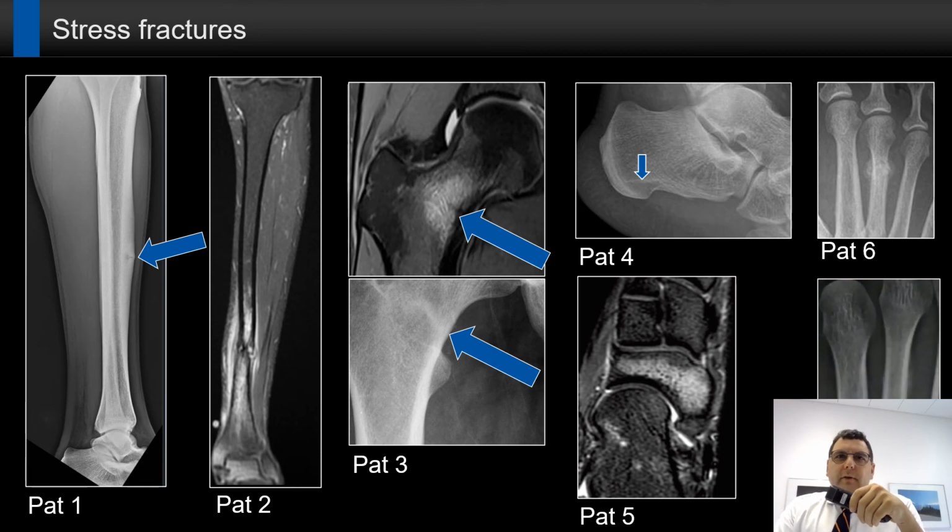Stress fractures are quite difficult. This is a patient who had a typical stress fracture of the tibia bone. This is another patient who had a complete fracture based on a stress fracture. Then you have already seen this type of fracture from this first case, and they are quite often seen, especially in these long distance runners or triathletes. This is a case from a Swiss triathlete here.